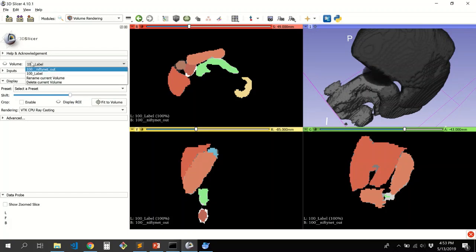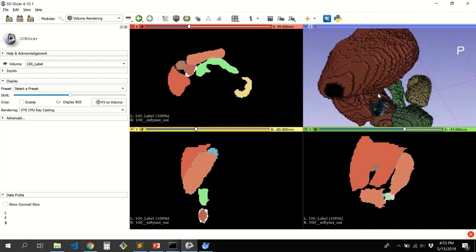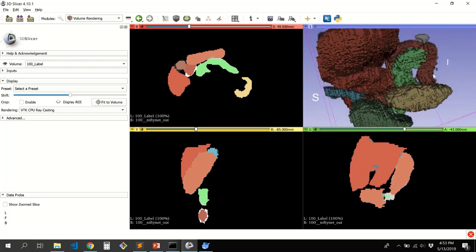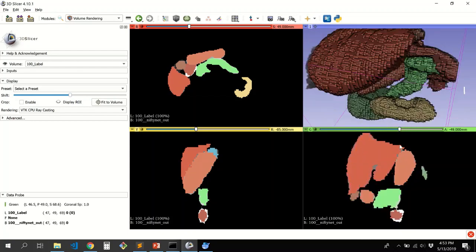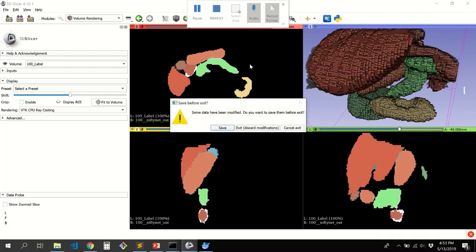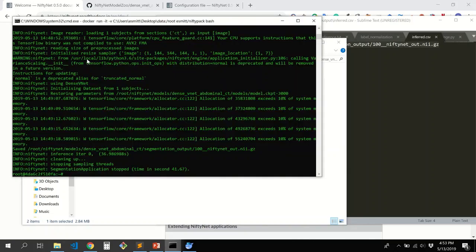What happened to this? Okay, now we're superposing the two of these on the output. Visually that's not very different, but well, you know what the result is. So NiftyNet works very well here, and you only use it inside the containers without needing to install anything on the machine. Only the Docker client, of course, because you need that to execute.